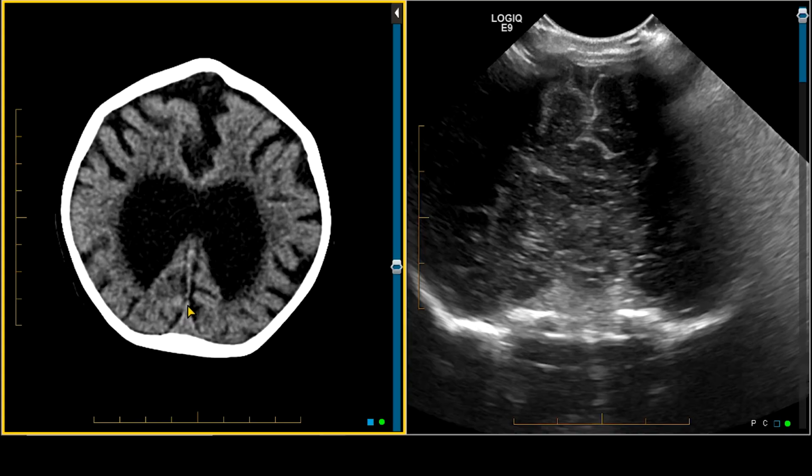Now, posteriorly, we are seeing a falx cerebri. Anteriorly, we do not see a falx cerebri. So this is an individual that has elements of a holoprosencephaly spectrum disorder, but posteriorly, we look like we have two different cerebral hemispheres, unlike the case of the alobar holoprosencephaly that we saw, but anteriorly we're seeing signs of a single cerebral hemisphere.